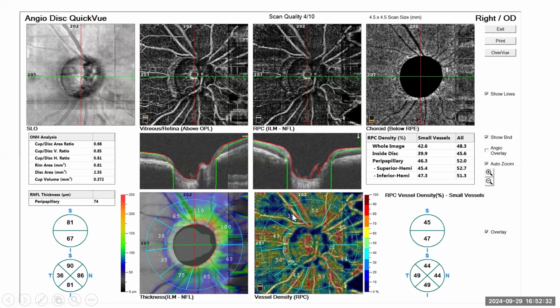The areas of capillary perfusion are warmer in color, having green or red, like this one now is 50, it is green. I'll get you an area that is 43, for example. Here, you could see this dark patch area. That's an area of capillary non-perfusion, okay?